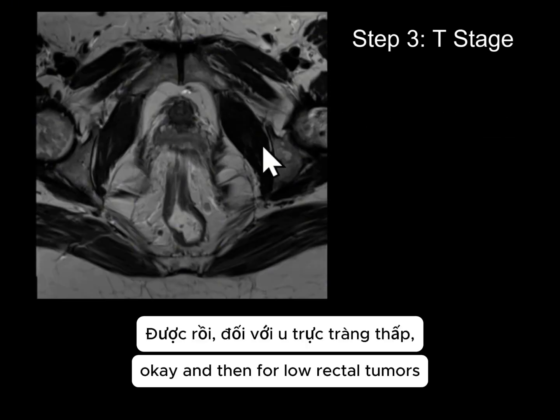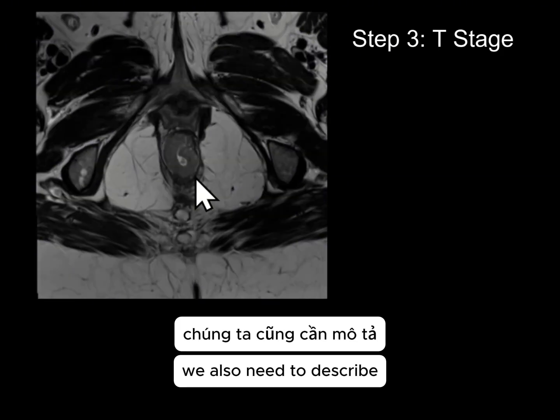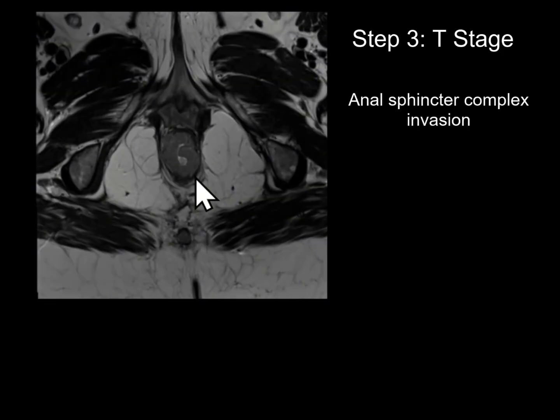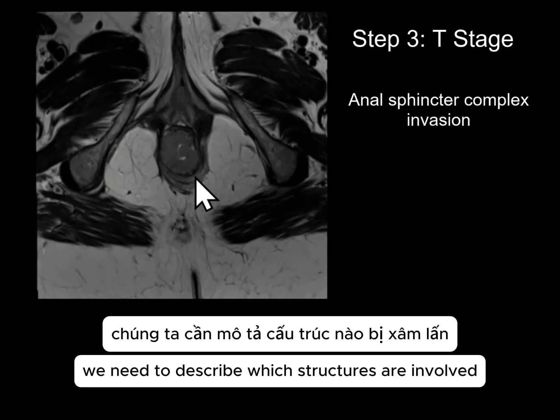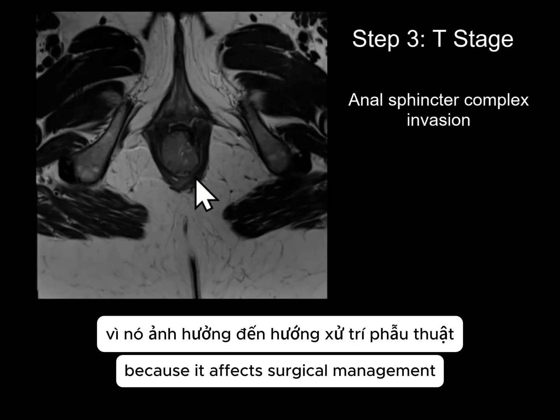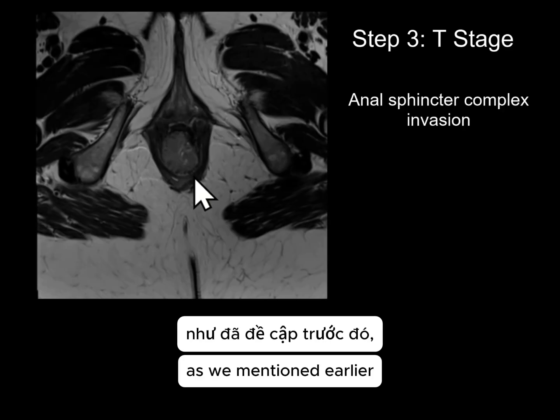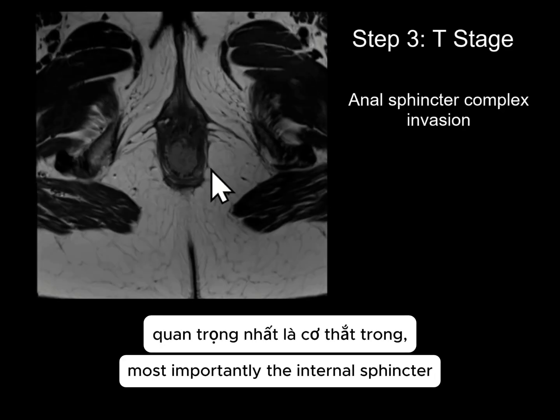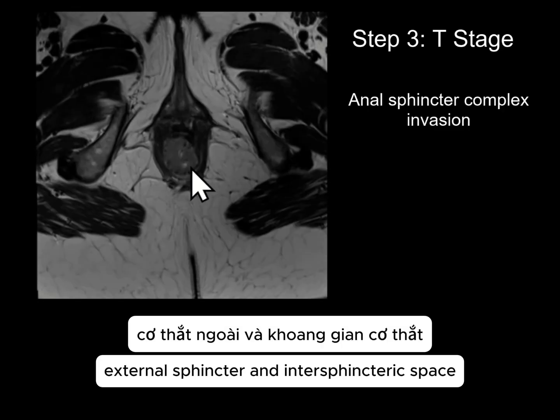Okay, and then for low rectal tumors, we also need to describe whether there is anal canal involvement. If there is, we need to describe which structures are involved because it affects surgical management, as we mentioned earlier. Most importantly, the internal sphincter, external sphincter, and intersphincteric space.